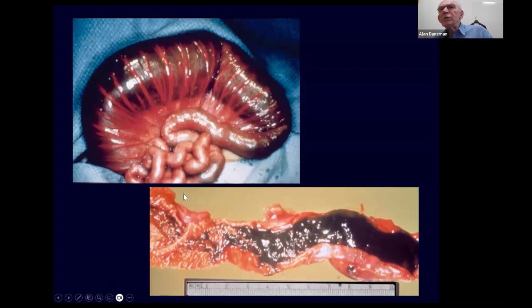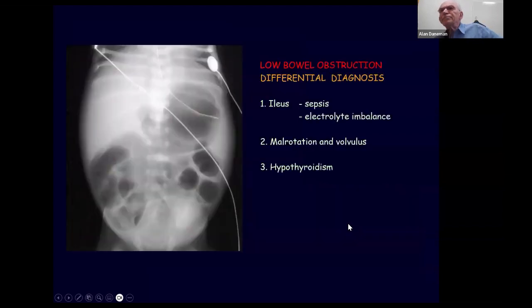This is the patient with cystic fibrosis. You see the dilated bowel proximal to the plugging in here. You can see the beaded appearance. When you open the bowel, you see this very black, thick meconium, which won't form that nice air fluid level. And that's the reason why the bowel is black. It's not poorly perfused. You can see there's a lot of blood in these vessels. It's the intraluminal content that makes it look black.